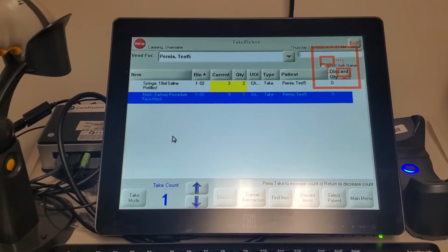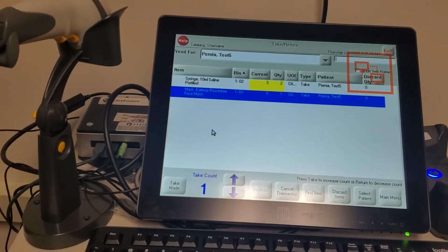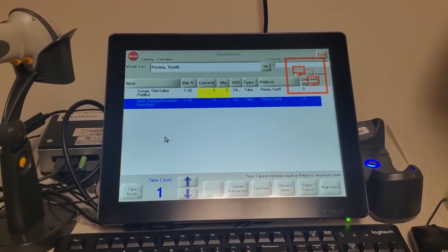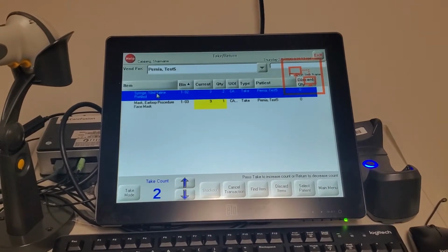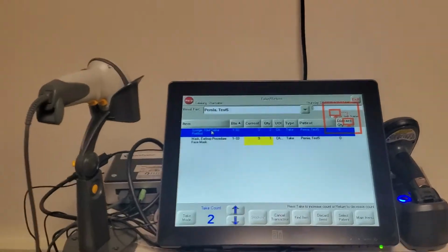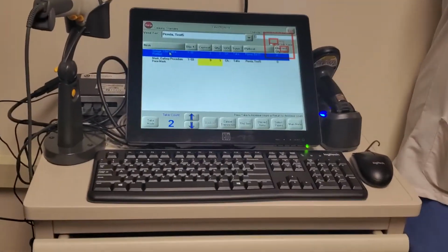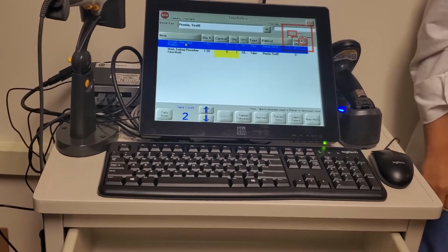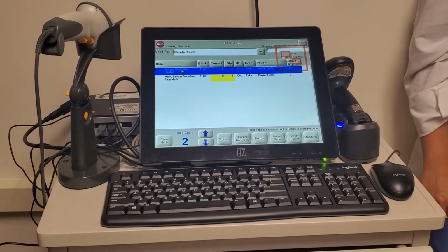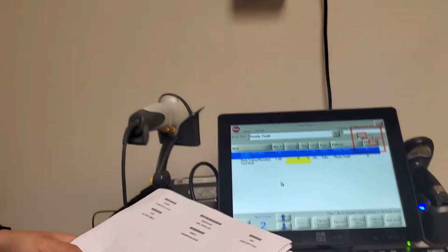So if you guys are shopping and putting items in a basket, this is a temporary holding for now. Then you can just put it right here, and then you scan. So can they put supplies, for example, say it's trucks, in this station and then have a binder so that they can just scan from the binder? Yeah, we can provide binders. Once you guys set up the items, I can print out something like this, and it's all going to be on paper. Is that what you guys want?